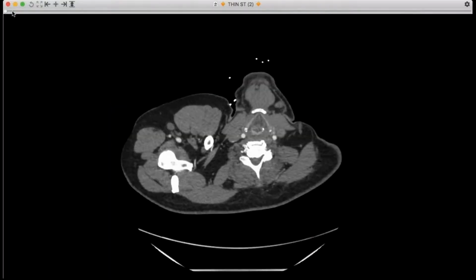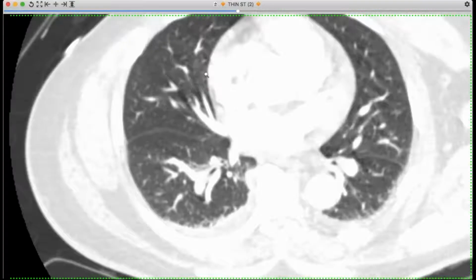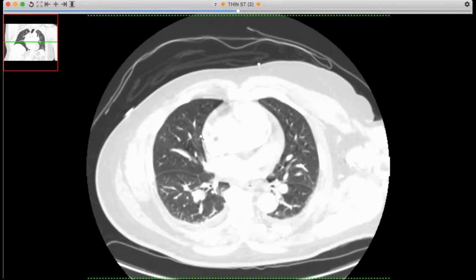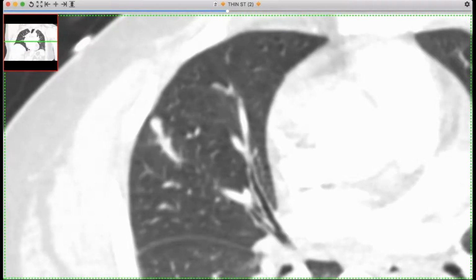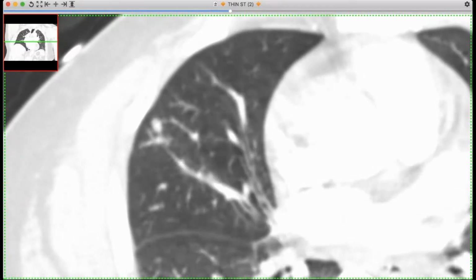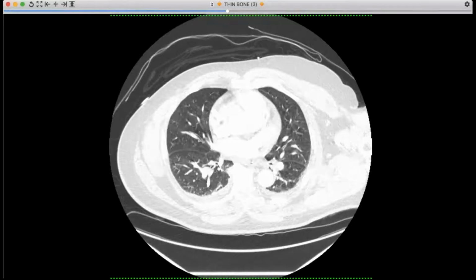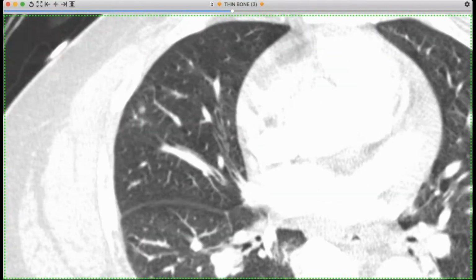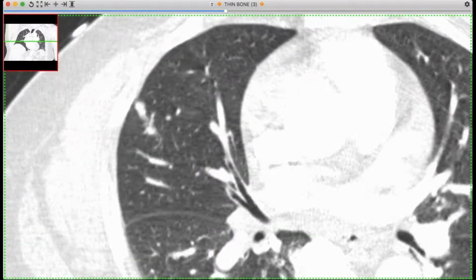But what I want to show is that I went back, knowing what we were dealing with, and looked very carefully at this outside CT, at this original presentation, trying to decide, can I distinguish this from an airway lesion? Unfortunately, I need the sharp images. There we go. I can't follow an airway into it at this point because the airways are too far. They're normal, so we don't see one.